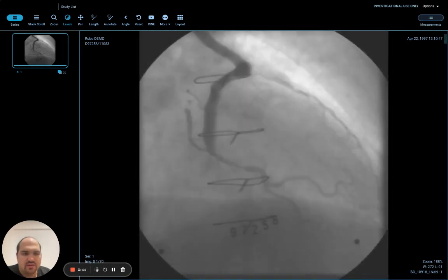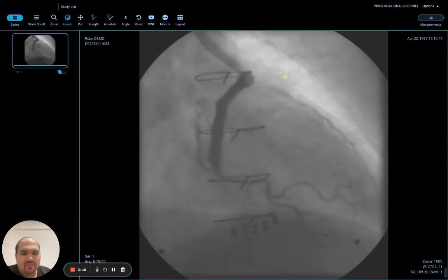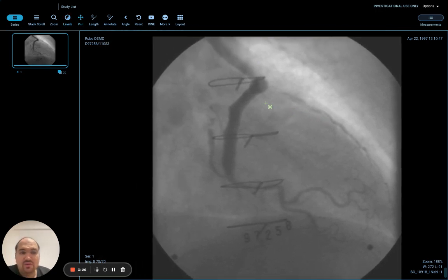Colleagues who've used this kind of thing before know that by the time they change the window even a bit, the entire image seems to have to load up again from scratch, which I don't really see why. You can annotate, you can do whatever you want really. And then at the end of it, you can send the images to a colleague to have a look at with or without your annotations.